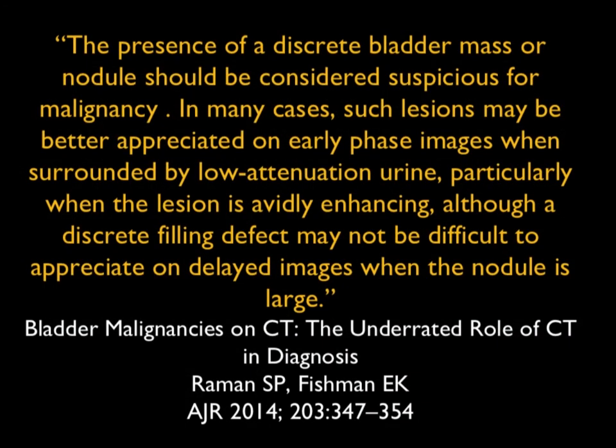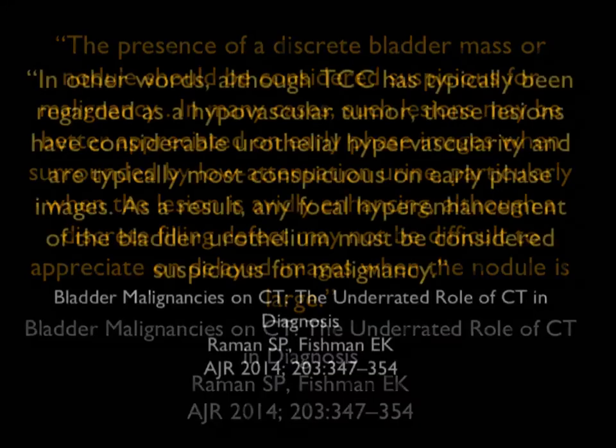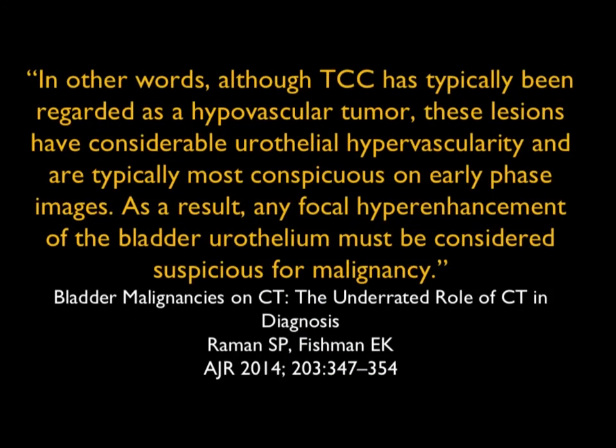Now, in this article, we did make the point that any nodule in the bladder that's enhancing, you've got to be thinking that this is going to be a tumor. Although TCC is typically regarded as hypovascular, they do have some vascularity, and any focal site of hyperenhancement, even if it's 1 or 2 millimeters, needs to be investigated further. And again, just a very, very nice example.